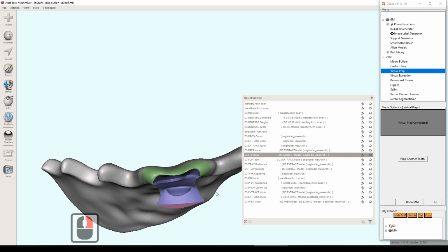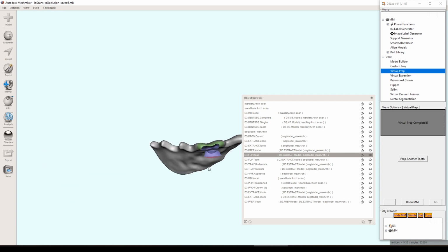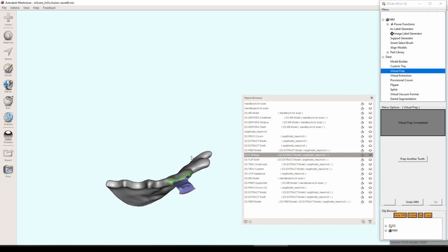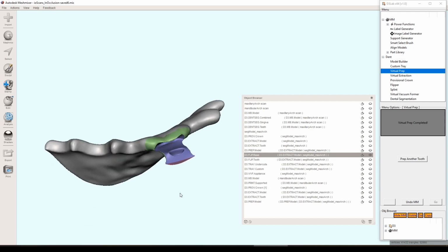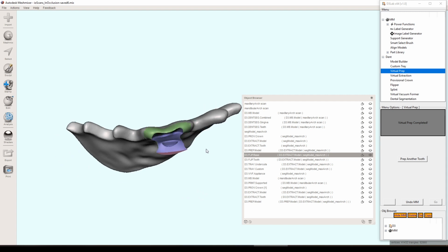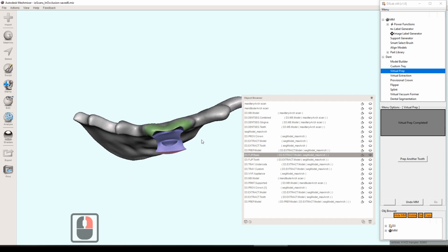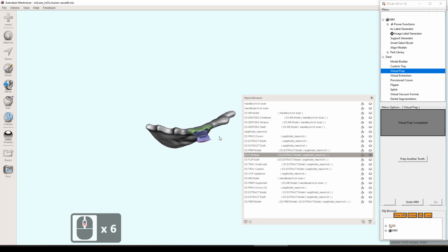Pardon me, it just makes a more uniformly cured final product. So I have all this built in to aid with that process. It won't just fumble around on you. It should snap in. And what I found is if you already have the model there, you put all this together on the model and do your little tack curing there. It's really simple to get this done. And this took a long time.